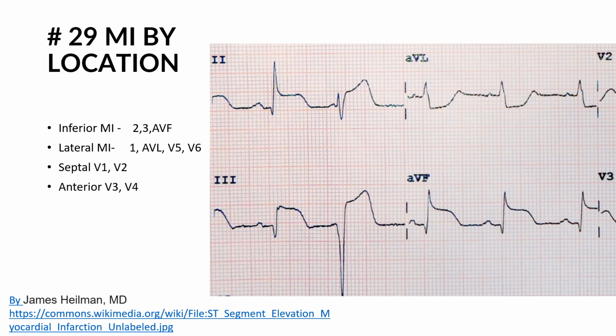Well, it's the same thing with the heart, right? If I see this in lead 2, but I don't see this in any other lead that's looking at the same part of the heart, I don't think that person's having a heart attack. I'm not sure what's going on with lead 2. I'm definitely going to look a lot closer, maybe reach out, phone a friend, and say, hey, what the heck's going on here? But if the only thing that's going on is lead 2, they're not having a heart attack.